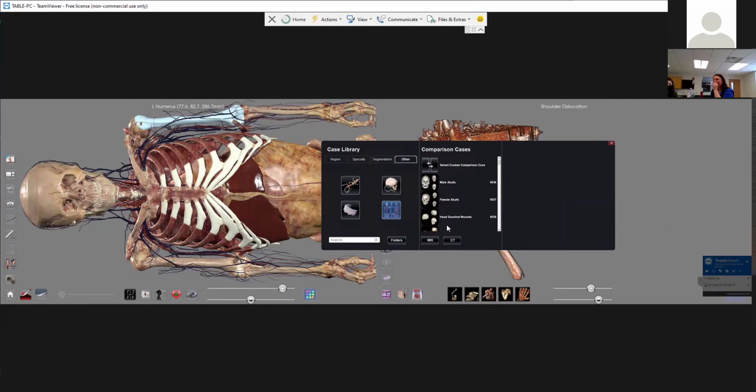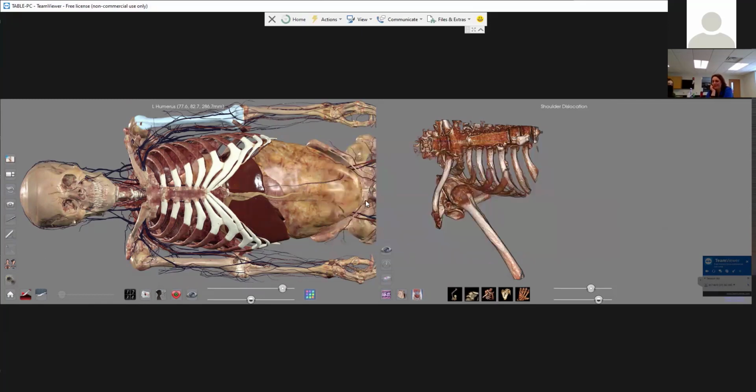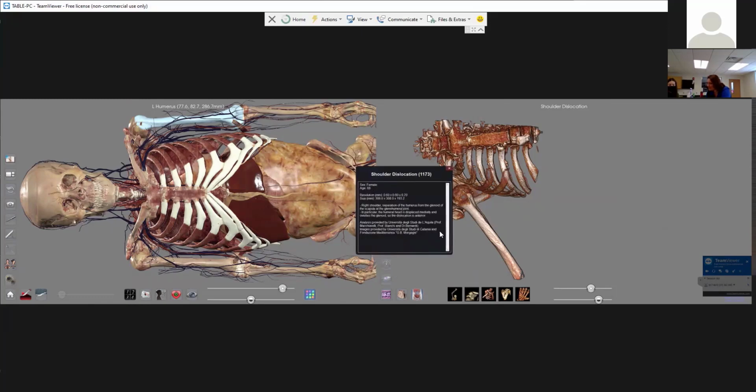If you open the case library by itself, so not within gross anatomy. Before we go there, Jordan, I'm sorry to interrupt. No, but go ahead. Show me in here, how do you get into description? I see the image, but I know there's also the case description. Yeah, it's this info button. Oh, okay, so it's the same. Yeah. Okay, I see. Yeah, thank you.